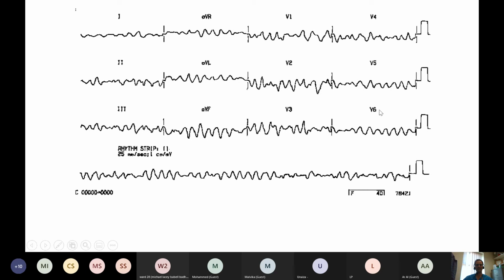Yeah, this is a 12-lead ECG that you really don't want to have captured under your watch. So if it happens before you get there, that's fine, but you don't want somebody to do it because you've asked for a 12-lead ECG. So this is ventricular fibrillation. You can see that this is relatively fine VF, and it's completely irregular. It's not forming any sort of pattern. This isn't torsades because it's not corkscrewing around. That's what you might confuse it with, but look how broad and unpleasant looking this is. So this is ventricular fibrillation.